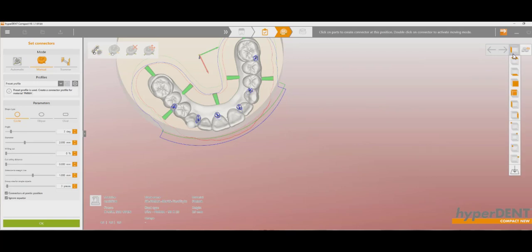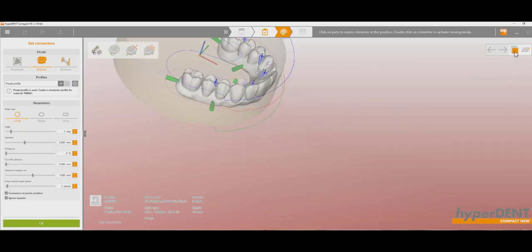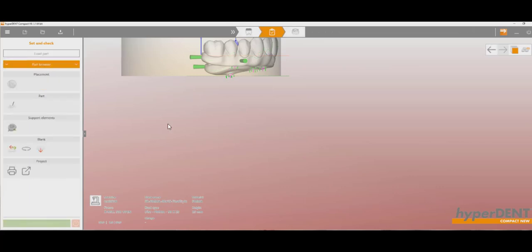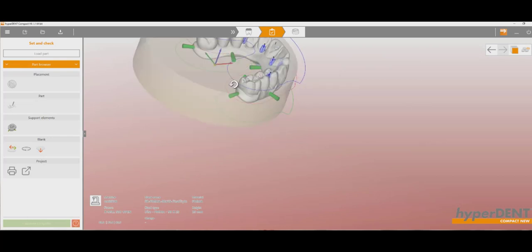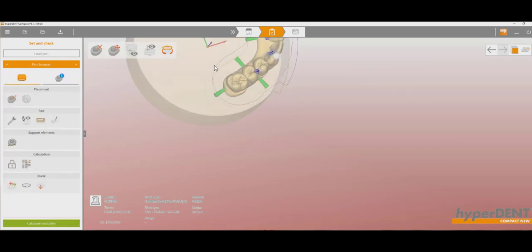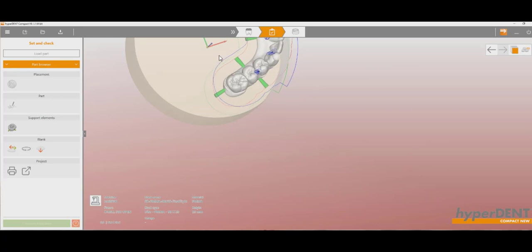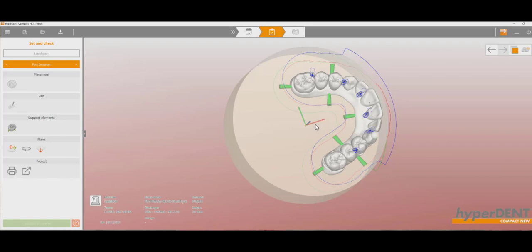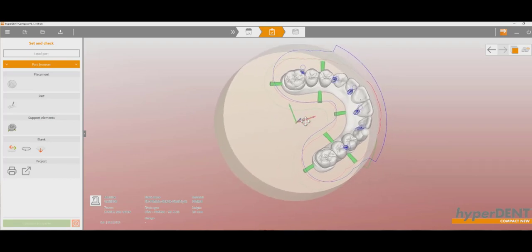Now also for views, you can use these buttons, and then to move it, oh, let's see. Actually, let me hit OK to get out of that. And let's see, to move the whole disc, you'll hold Control and hold the right mouse button.